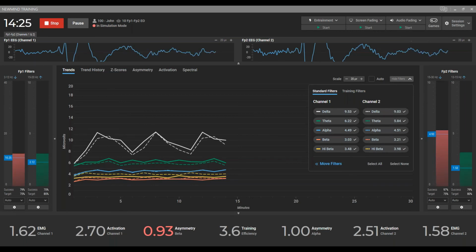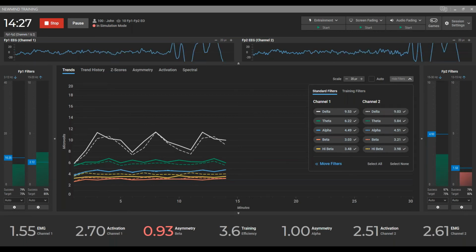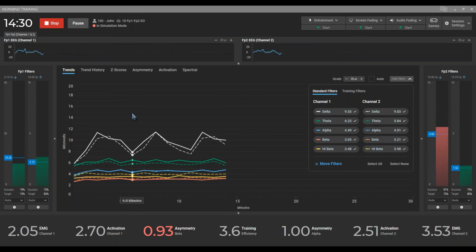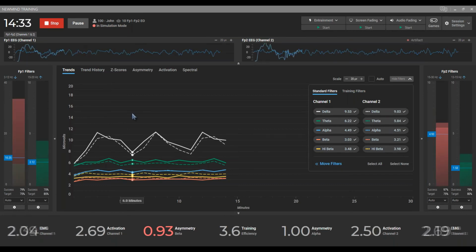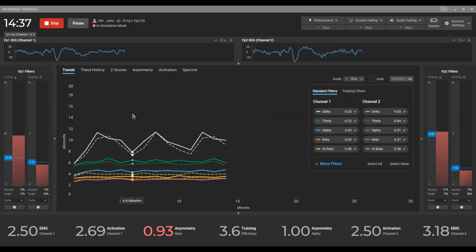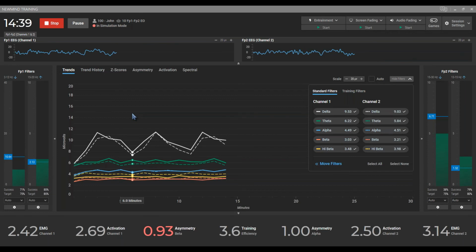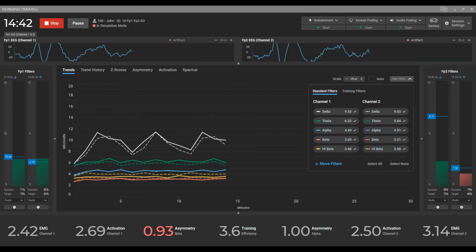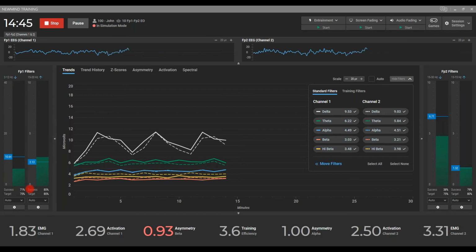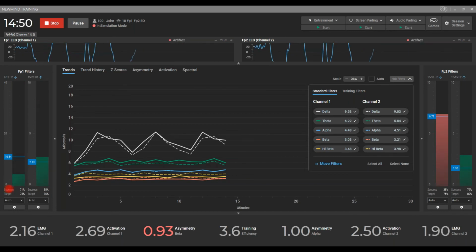Can you point to what Rob was just talking about on the success and target, and go through that one more time? That was interesting. Yeah, so let me put a little spotlight, a little highlighter here. For every threshold, you've got a success percentage and you've got a target percentage. When I was dealing with BioExplore, we used to refer to the target percentage as a reward percentage.